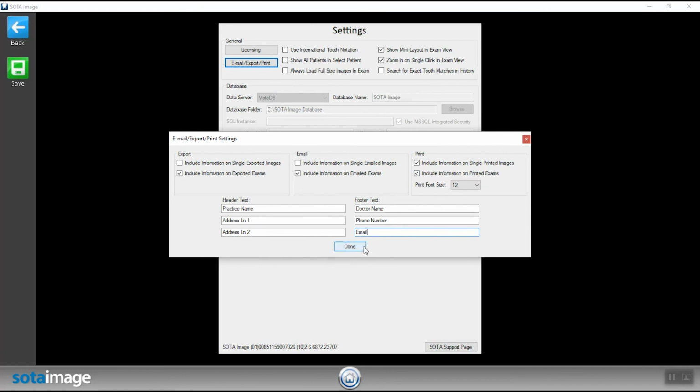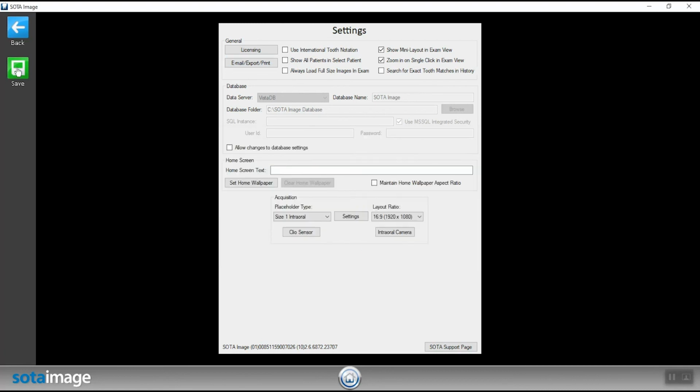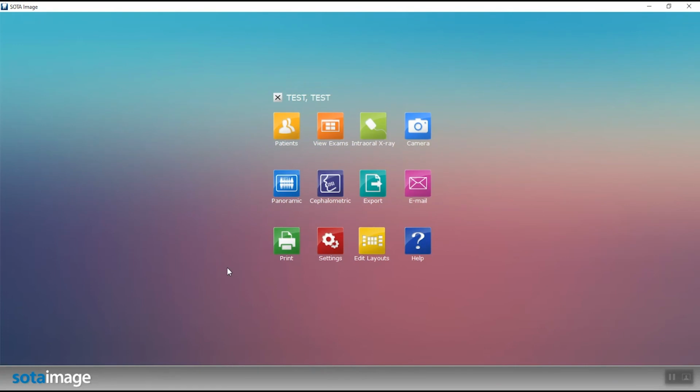So I'm going to go ahead and click on Done here, click on Save, and now I'll show you exactly how it's stylized.